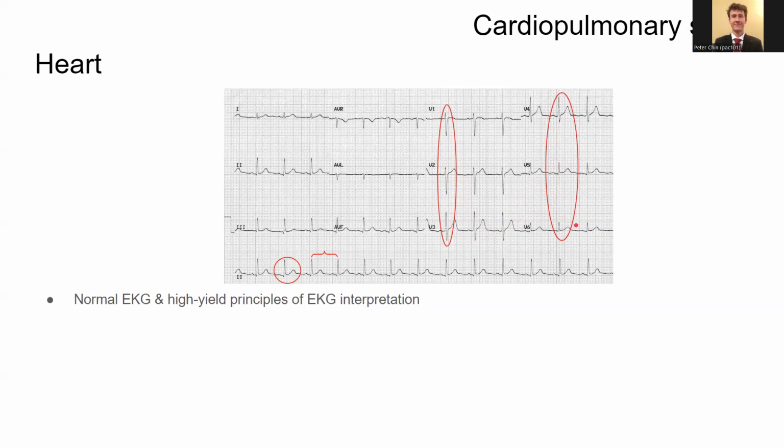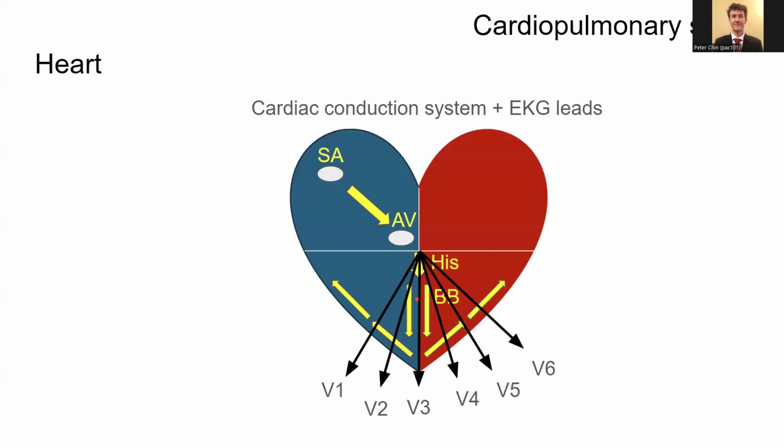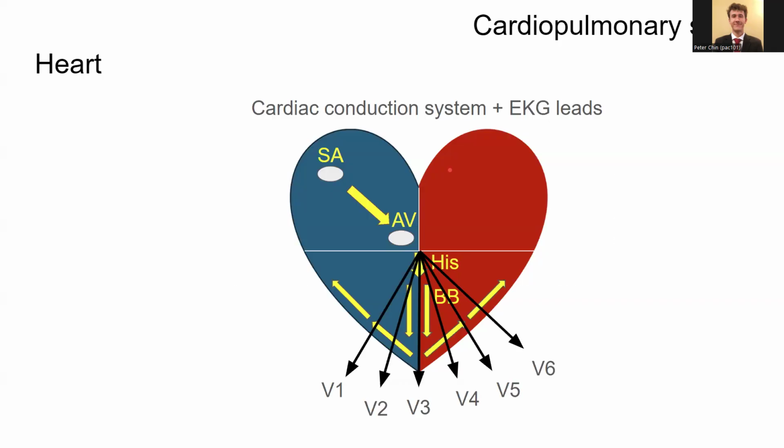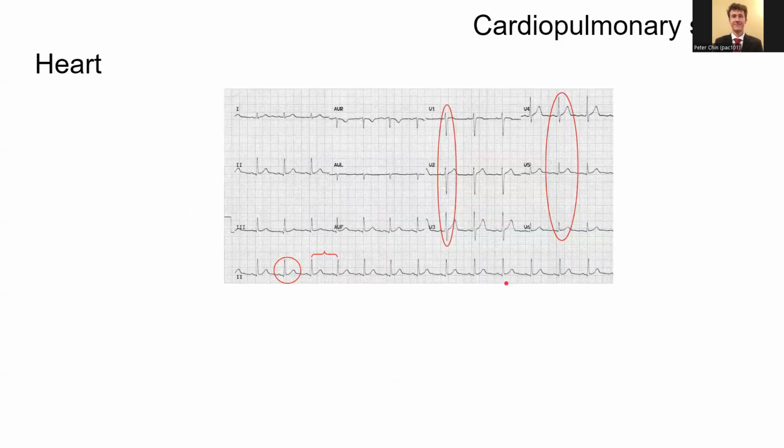If you look back at this diagram and think about the QRS complexes, in V1 the little initial upward deflection followed by the downward deflection represents right ventricular depolarization, that little upstroke, and then left ventricular depolarization away from V1, that downward deflection. But that's as detailed as I'll go. The same goes for V6: the right ventricular part is just a little downstroke, and the upstroke is the left ventricular depolarization.